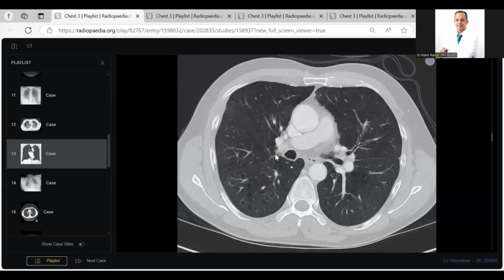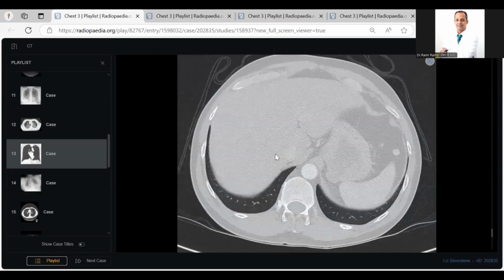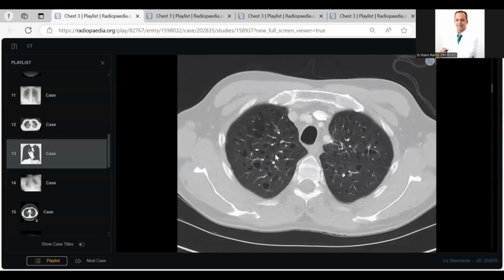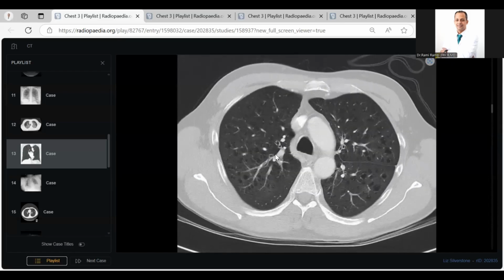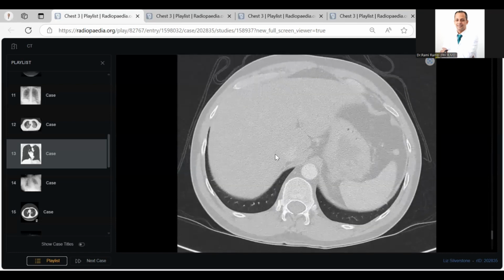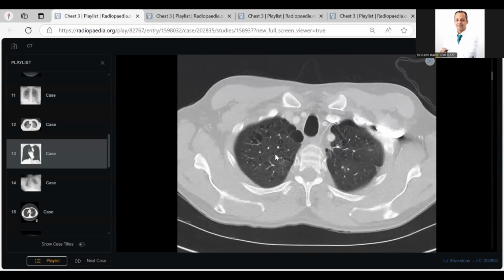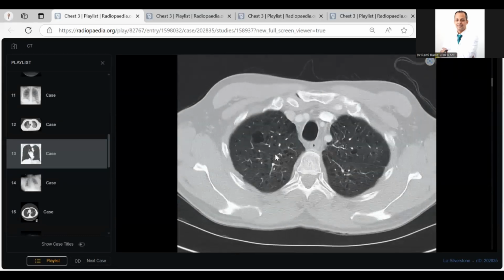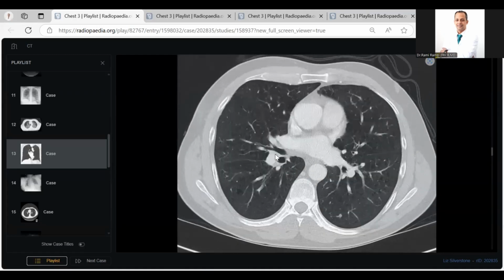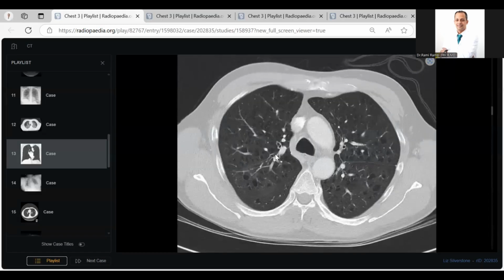Okay, so I would look for any neoplasm. Mostly it could be pathological fractures. I would look for any source of... The bones are okay. Concentrate on the lung parenchyma. What's your differential diagnosis? Sorry, what was the history you said? Can you please tell me the history of the patient again? History is irrelevant. This is a middle-aged male patient, and you find all of this parenchymal lung change. What's your differential diagnosis?